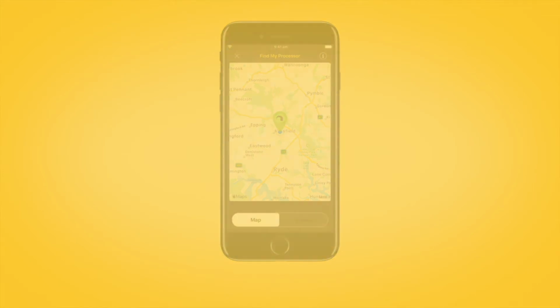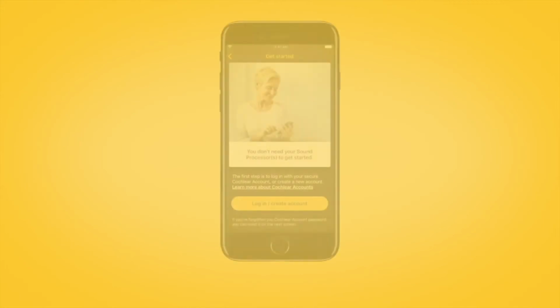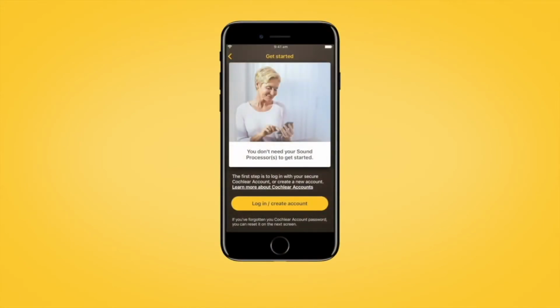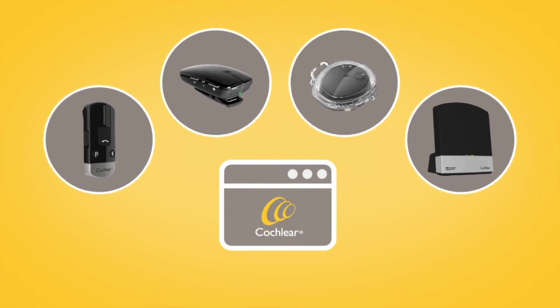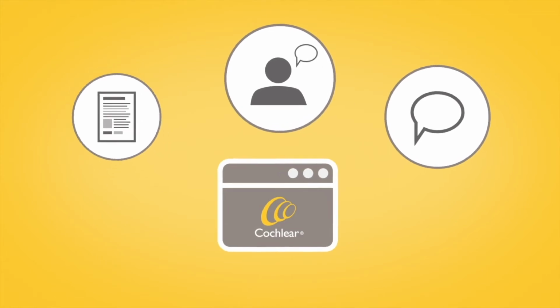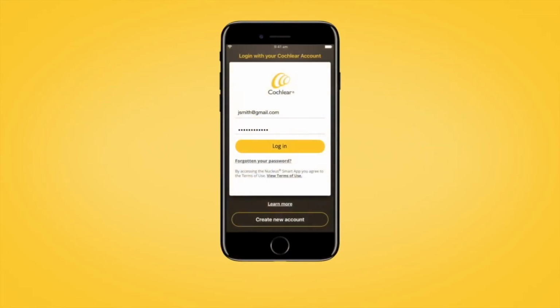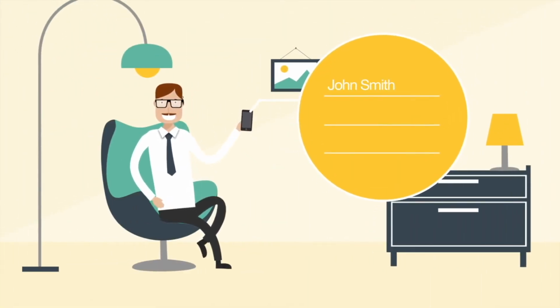To get started, download the app from the Apple App Store or Google Play Store. To use the Nucleus Smart App, log in with your Cochlear account if you've purchased a Cochlear product from the online store or have used a Cochlear online service in the past. You may already have a Cochlear account. If you do not already have a Cochlear account, tap Create New Account. Then follow the instructions in the Nucleus Smart App to set up your Cochlear account.